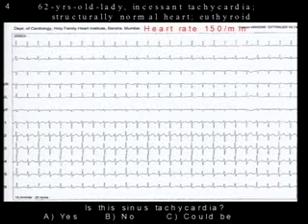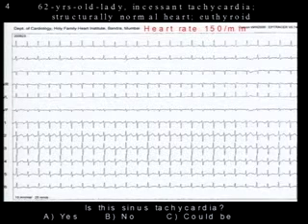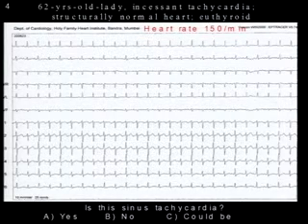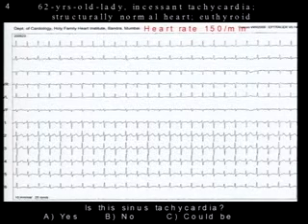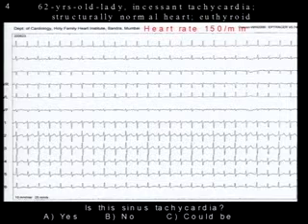But there's one more sign on the ECG which is interesting, which is QRS alternans. If you look at lead V2 and several of the other leads also, there is QRS alternans which to my mind has not been described with sinus tachycardia. Anyway, even if we leave QRS alternans aside as a minor point, the fact that the patient has incessant tachycardia, and this is where we say the correct answer, if we look at the ECG in isolation, could still be C, that it could be sinus tachycardia.